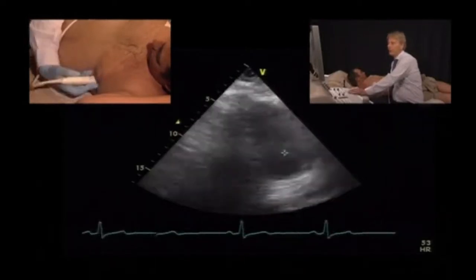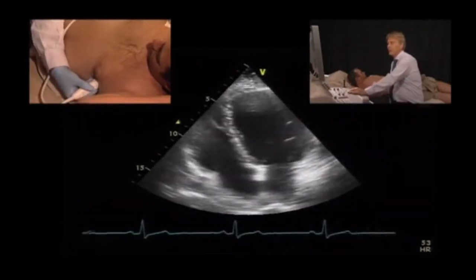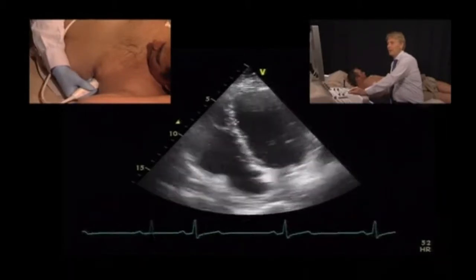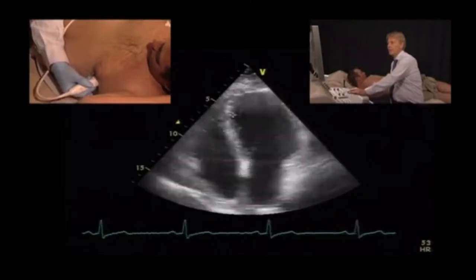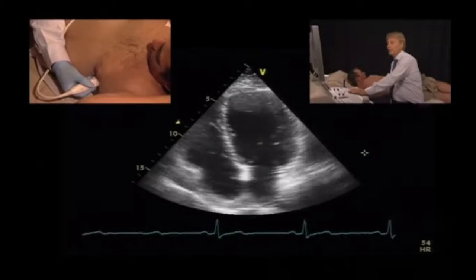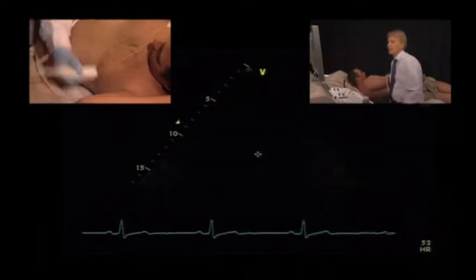So, in conclusion, this is a patient who has a fairly small myocardial infarction, which is located in the apex, which has a scar here in the apex and probably some form of non-transmural myocardial infarction, probably in the septum, but with good remaining left ventricular function, and no other portions of the myocardium show wall motion abnormalities. Okay, so this was an example of an anterior infarct.